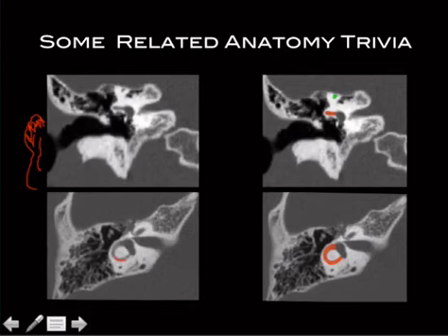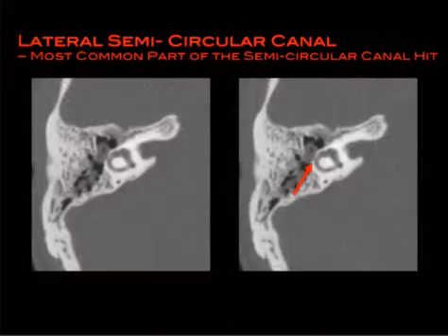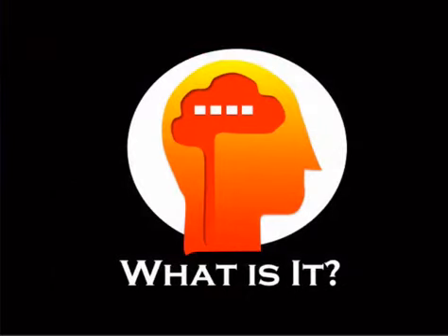And so this is the lateral segment of the semicircular canal. Now, who cares? People who write multiple choice tests care, so you should care. And this is why. If you've got a cholesteatoma here, this is an axial cut, and we're in the attic, the epitympanum, you can see that it's going to hit that part first, right? That's the part that it's going to be eroding first. So which part of the semicircular canal gets hit first? The lateral part, as the cholesteatoma is going to work its way lateral to medial into your brain.